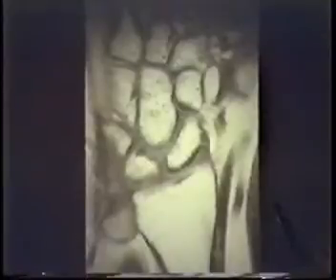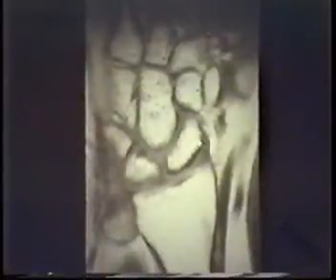Other planes can be very nicely imaged with the tendons. This is probably one of the best planes of all, and you've probably seen there have been several articles in the literature discussing evaluation of the joint spaces, especially if you put water or something in after arthrography. This is very good for difficult fractures to determine by plain films. MR, again, is the best technique there is for fractures, I think. And for hamate fractures especially, this can be very useful. For avascular necrosis, Kienbock's disease, and so forth, I think MR can be very useful.